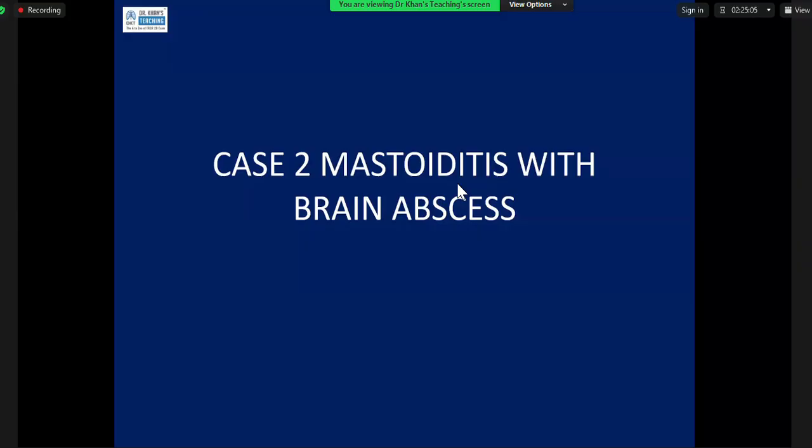So the first point is keep it simple. You have to ask for the simple thing first. At 2 o'clock in the morning, you don't ask for an MR, number one. The basic thing is change of windows, bone window. And then do a post-contrast, which is what we do in any emergency case. So these were two feedbacks for you. Think like you are in an A&E scenario and how you are going to tackle this. Second thing is uncal herniation, and we will come back to that.